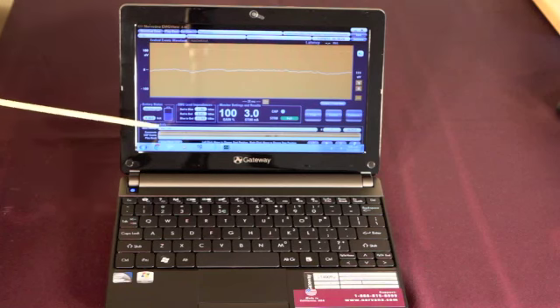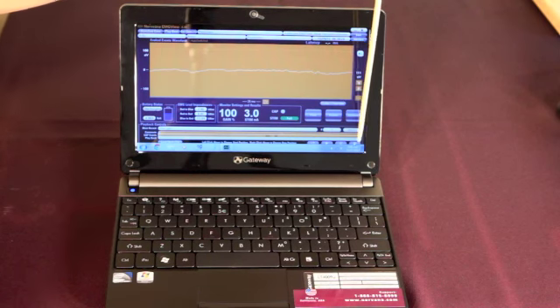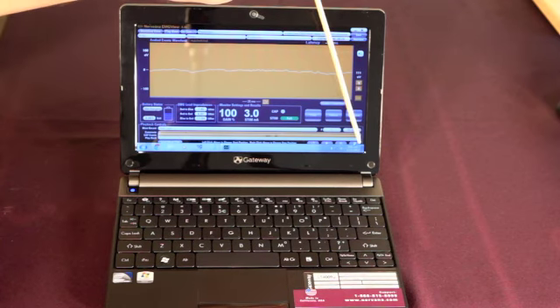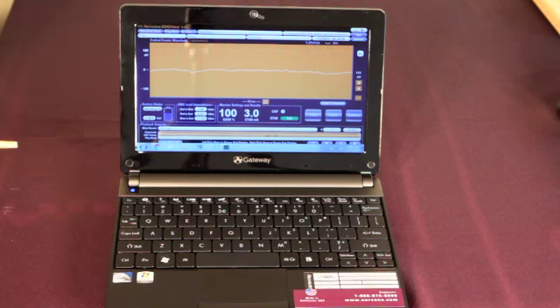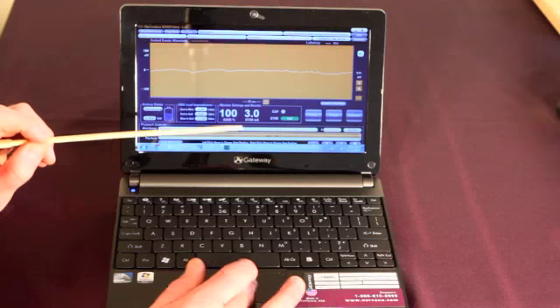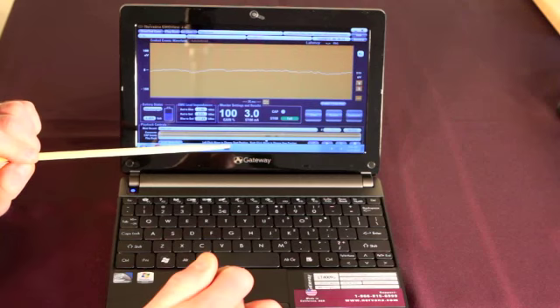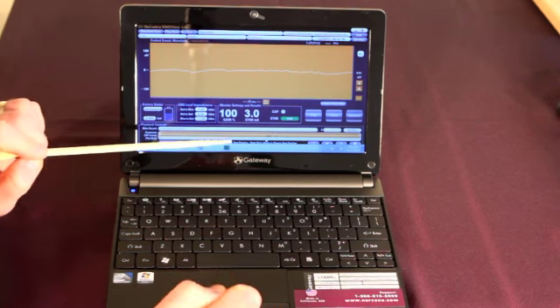Now I'm going to move something that I haven't yet pointed out. There's a green bar here on the playback at the beginning, and there's a red bar at the end. Those indicate the start point for the playback and the end point. By default, the start and end points are the beginning and the end of your recording. However, you can change that to review a specific part of your surgery that's most relevant. I'm going to do that now. I'm going to come over here, and in this bottom white playback bar, I'm going to left click, that's my typical mouse click, right there.